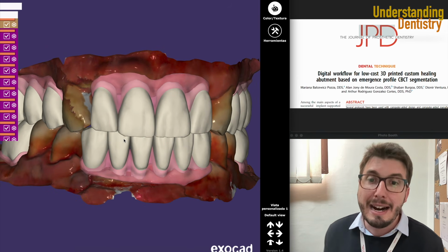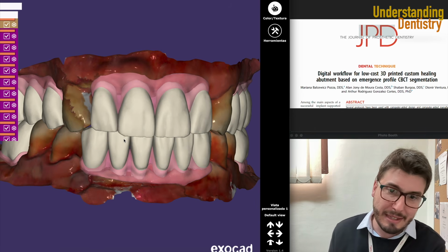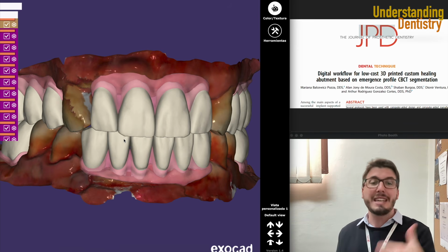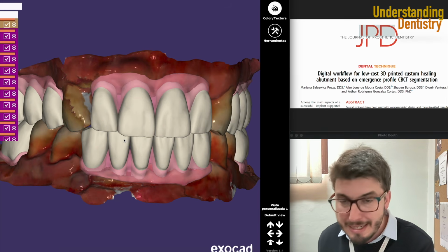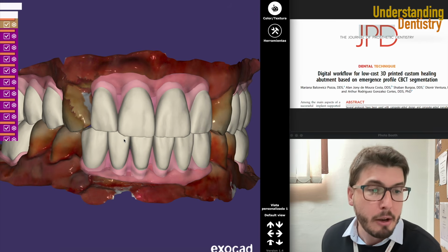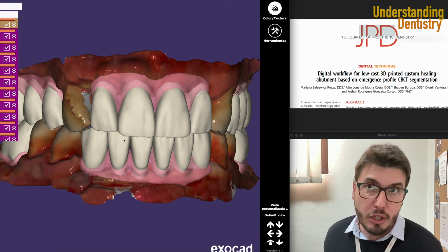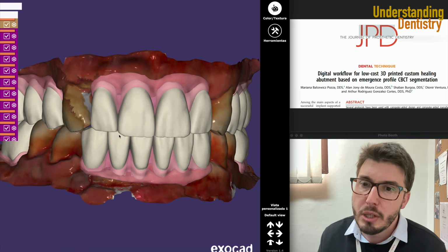And then after the prosthesis is planned, you plan your dental implants, which in this case it seems was already planned. And then after the implants are placed, you could still scan those implants with scan bodies, so with the markers. Why would you do that? Why would you scan the patient again? To capture the final situation of the soft tissues after healing, after all the surgeries.